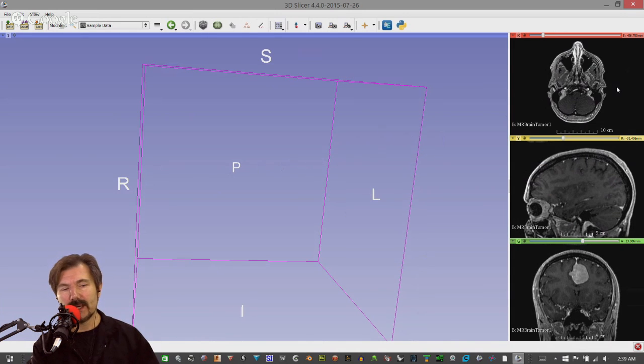So what I want to do right now is create a 3D volume. So that's the first thing I'm going to do. Now, what is a 3D volume? A 3D volume uses the graphical ability of the computer, like I mentioned, the graphics processor unit, to Javin earlier, of whatever you're using, either a desktop, or in this case, I'm using a laptop, to produce a combination of all the slices together. So it's taking that three-dimensional information to create what they call a volume.